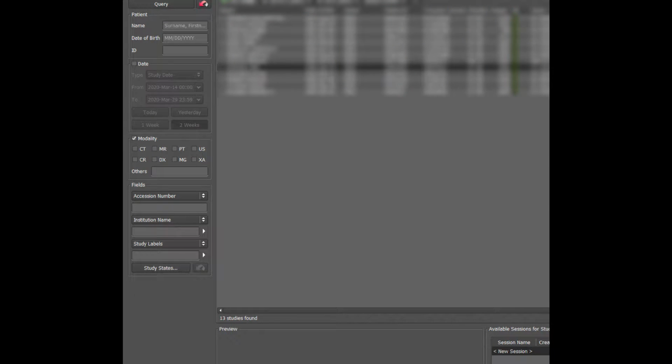We're going to talk about chronic pulmonary embolism. I often get questions about how can you tell between acute and chronic pulmonary emboli. So we'll look at the imaging features of acute and chronic pulmonary emboli in terms of the filling defects. And then we'll also talk about the consequences of chronic PE, particularly chronic thromboembolic pulmonary hypertension. And there are some specific imaging findings to look at for that diagnosis as well.